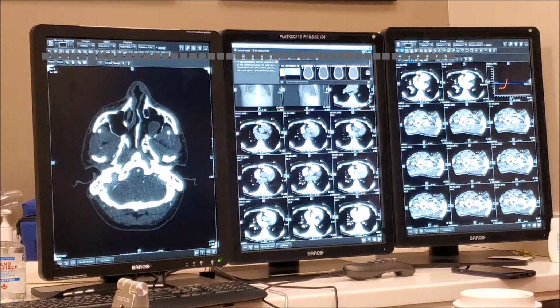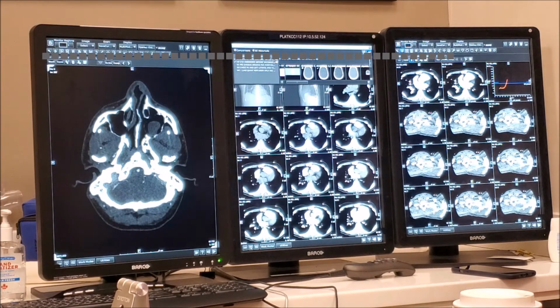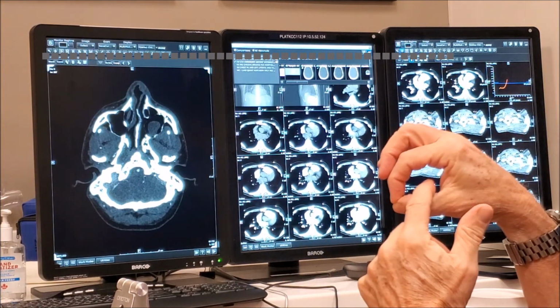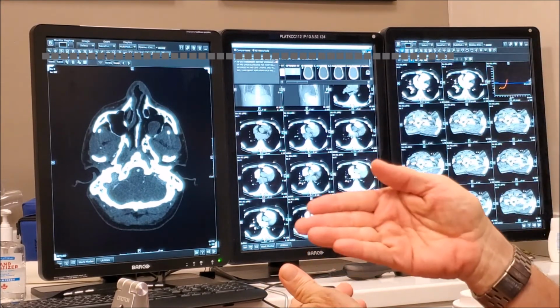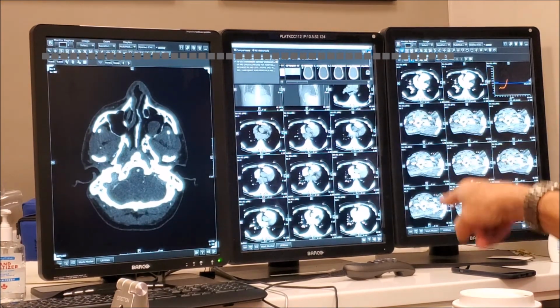Okay, what does that mean? You're trying to determine if there is a stenosis, or if you're born this way. Yes. So when you have the bone, it's the best way. So, the bone is big, but the vessel is small, that means it's an acquired condition. Make sense? The bone is the right size when it was developed, and then something happened. But if the bone is small, that means it's hypoplastic. If there are no foramina, there is agenesis, right? So what do you think is going on here? So it has probably been congenital hypoplasia. Correct. So leave that there, and let's go in the middle.